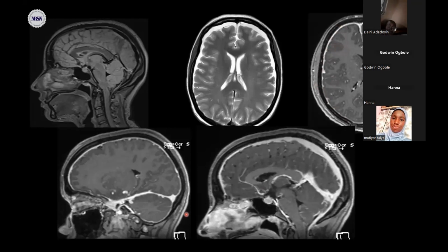Okay, so here on this sagittal image, we can see the venous distension as evidenced by this convex curvature of the veins here. All right, so in this image, we see that there's hyperemia of the enlarged pituitary gland, and this pituitary gland may extend beyond the confines of the sella, okay?